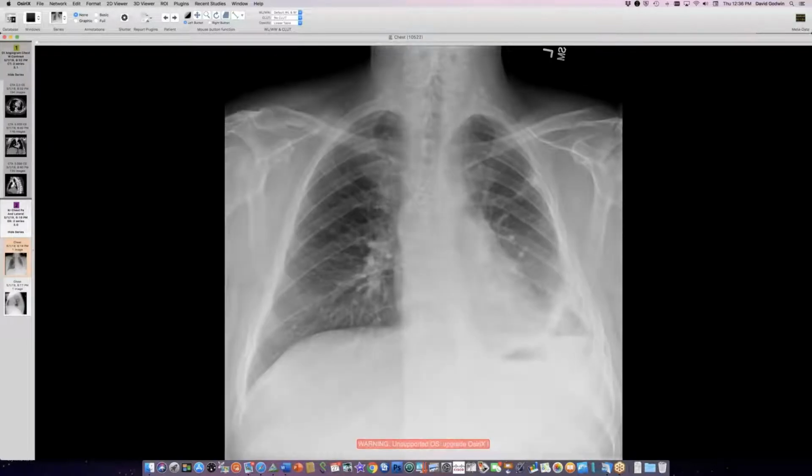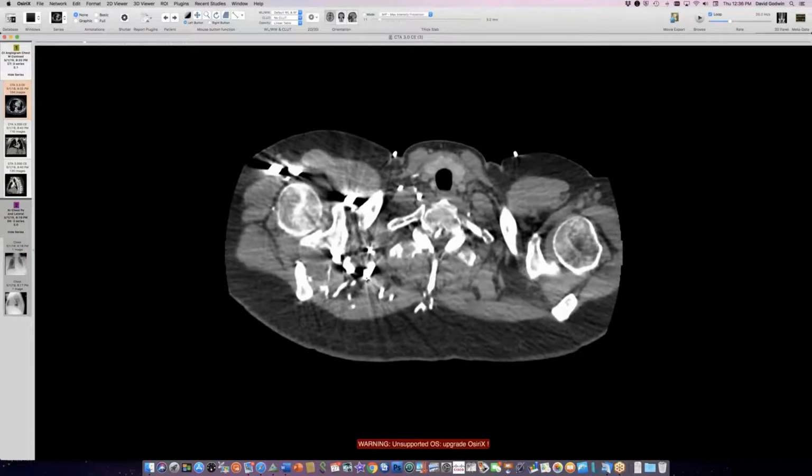So I wanted to show you a diaphragm case. This fellow had a few different surgeries. One of the more recent ones was a drainage of a pericardial effusion with a pericardial window on the left. But I went back to older CT scans before that procedure, which was done sometime around the beginning of the year or so, and he already had this pleural process on the left here. So he came here. Let me show you what CT looks like for him.